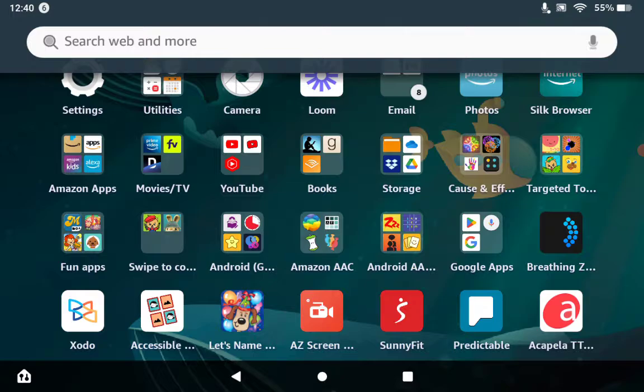So this video is going to assume that you've already sideloaded the Google Play App Store, you've already purchased and installed the Speech Assistant AAC app, and you've seen my video about how I was able to get Acapela voices to use over in this app, which was quite exciting, especially for Josh and Ella for child high-quality voices. So this is going to assume that you have all of that done.